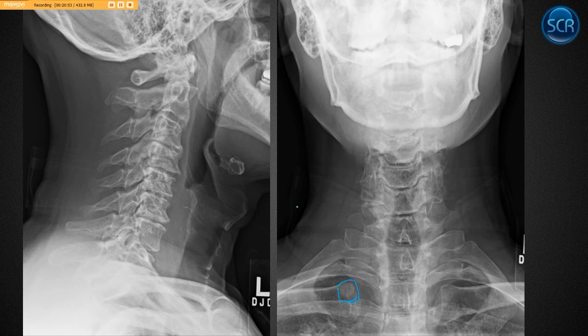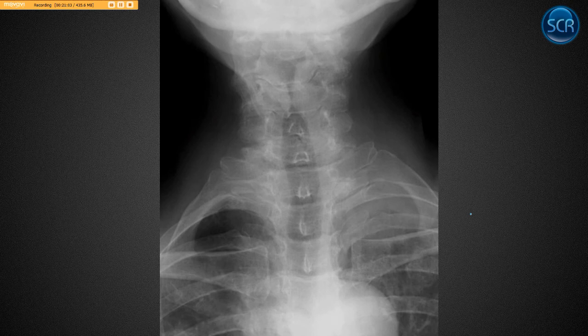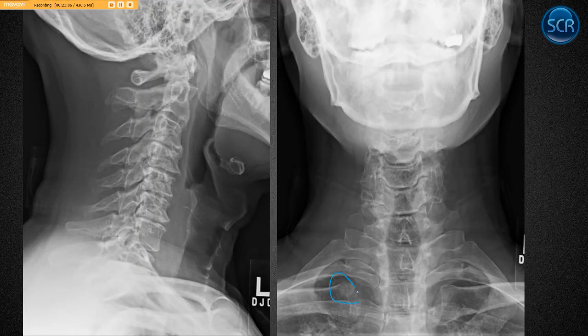They've got some button artifacts here from their shirt collar, which you can see is a big old shirt collar here. Another button artifact over here. How do I know these are buttons? You can look and actually see the four holes where the stitches go across. But I suppose you could mistakenly call that a neoplasm.